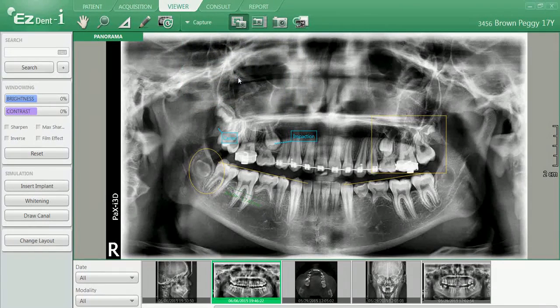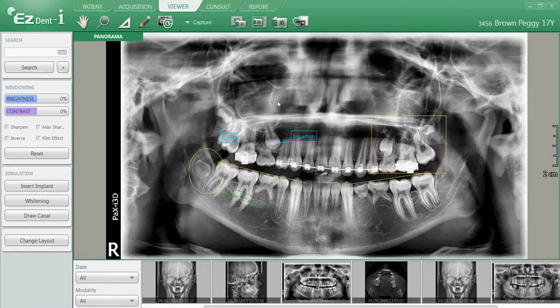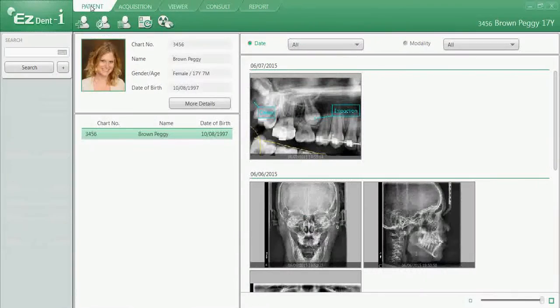Continuing along our toolbar, we'll now go down to Capture and do Capture Region. From here I can define a specific region within this image that I want to capture. I'll left click once there, drag my mouse across, and let go, and then left click on the word Capture. I've now stored a captured image of that cropped out region.